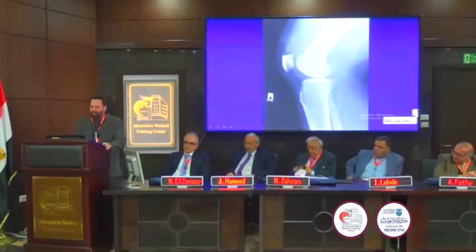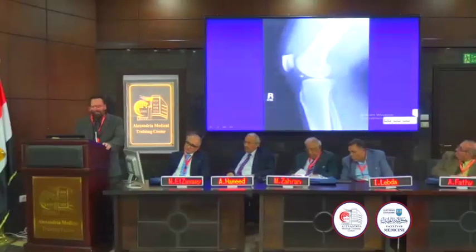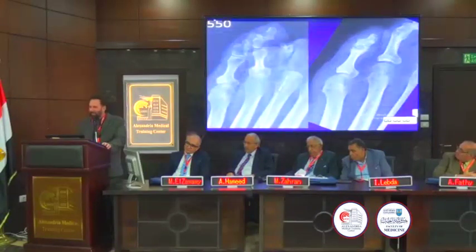IVDU, like we have a lot of in Detroit, joint effusion. But if you look here, the fluid is not parallel with the articular surface. I think it's hard to see, but it's not. It's kind of massive. I was kind of proud of myself. I called it septic arthritis, and it was Pseudomonas septic arthritis. Here's a patient. We see baseline film and then follow-up film.